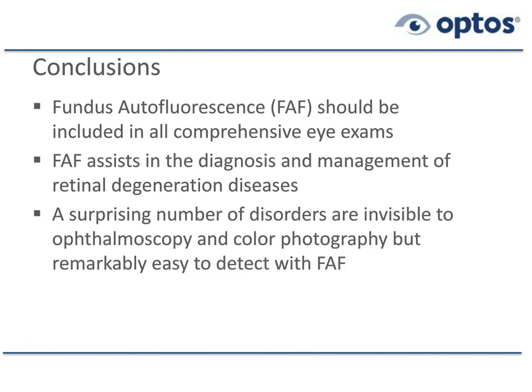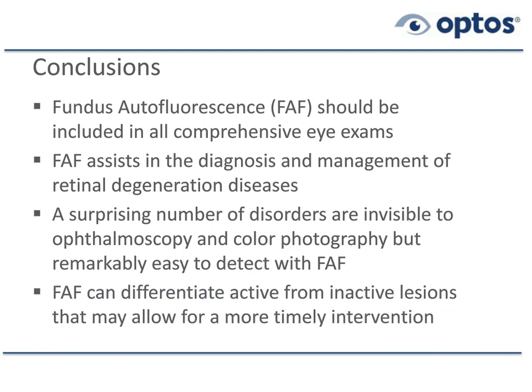And perhaps surprising to most people, there are a number of disorders that are invisible to ophthalmoscopy, even BIO and 3-mirror lens, and invisible to color photography, but remarkably easy to detect with autofluorescence. And certainly autofluorescence can differentiate active from inactive lesions in a lot of cases, and that may allow for more timely intervention.